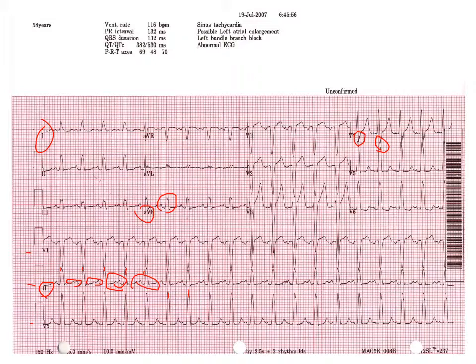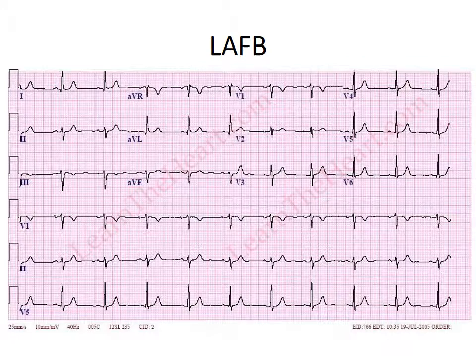The rest of this EKG, in terms of trying to determine ST elevations, ST depressions, kind of is out the window because that left bundle branch block throws off the EKG. That's something to know when you get out on rotations in residency. Let's move along.